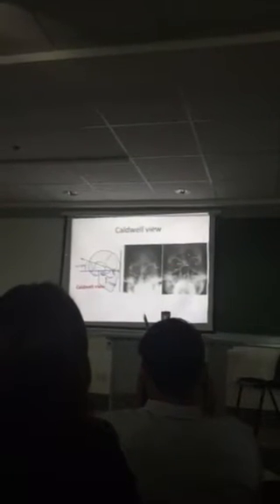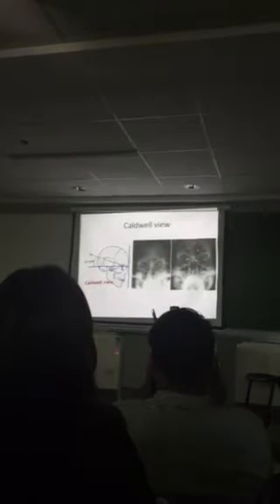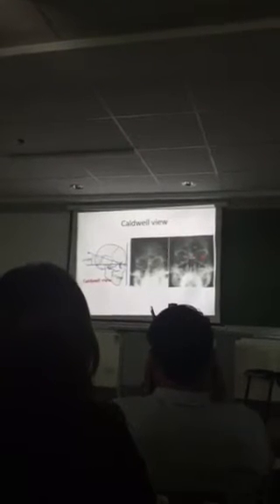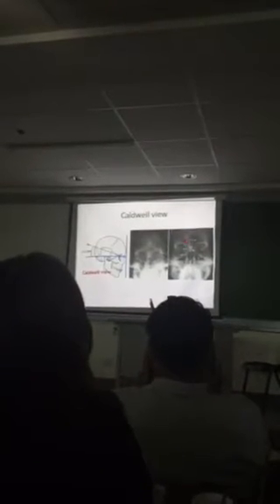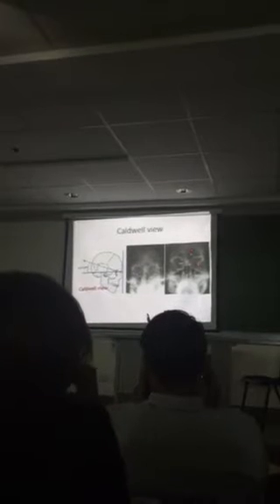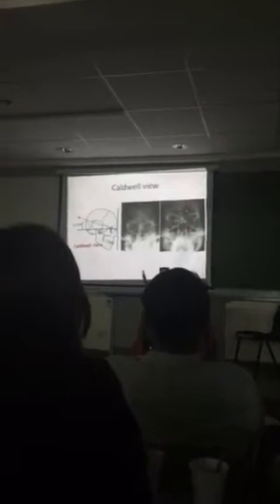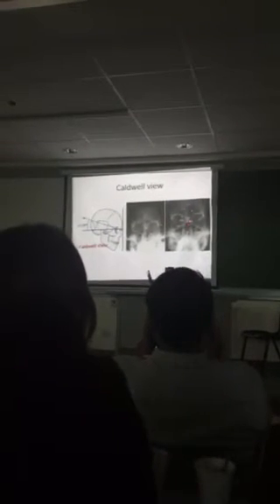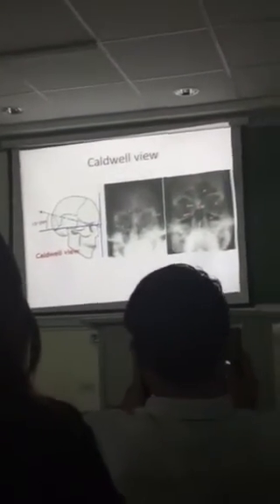So your clue is 15 to 20 degrees, and it focuses on the frontal part. So what is this? Frontal sinus. This one, orbit. How about this one? Maxillary sinus. Not here. The white versus the black one, ethmoid. When they ask about the bone, nasal bone.